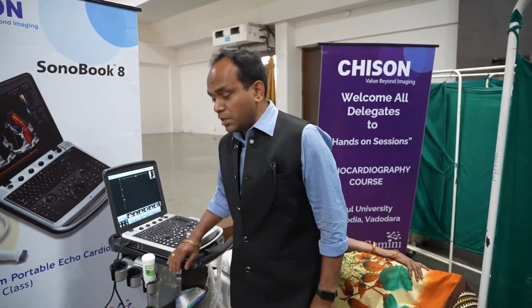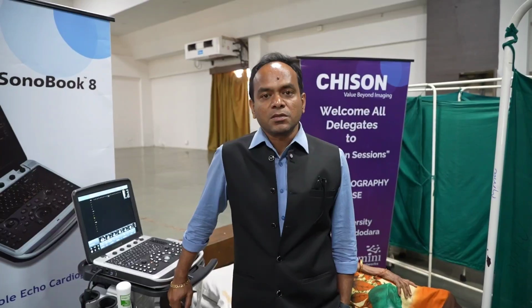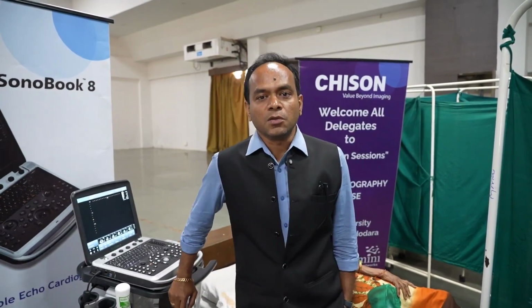And today we will see a very common disease that is very common amongst us, but sometimes it may lead to deleterious effects over the whole body. Especially it's a cardiac condition in an aged patient. So let us see mitral regurgitation really very fast and some of the indicators of how it can affect the body and some of the indicators that we can visualize directly on 2D echocardiography.